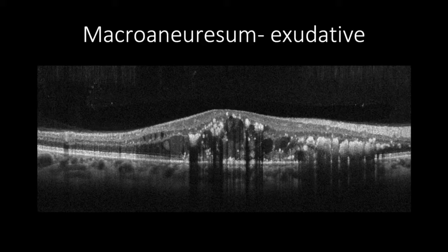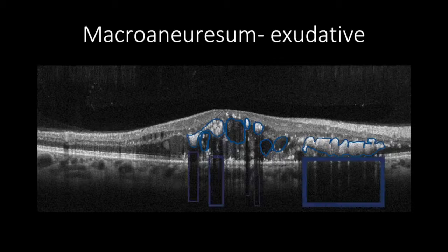In cases of retinal artery macroaneurysm, OCT may show increased macular thickening with cystic changes. OCT can have distinct features between exudative and hemorrhagic macroaneurysm. For exudative, there would be an increased macular thickening with empty or non-empty cystic changes and hard exudates that appear in the form of hyperreflective masses located at the outer retinal tissues that cast a shadow artifact.